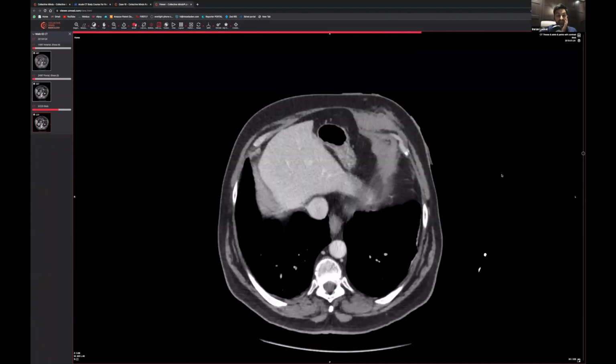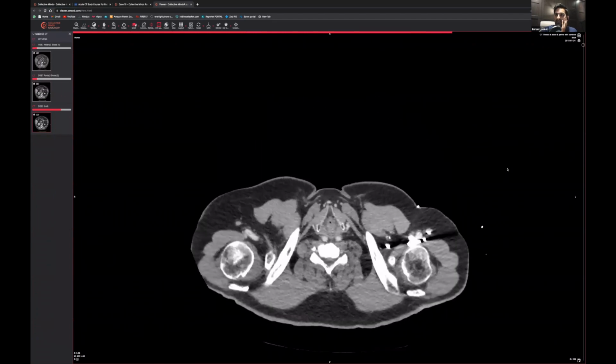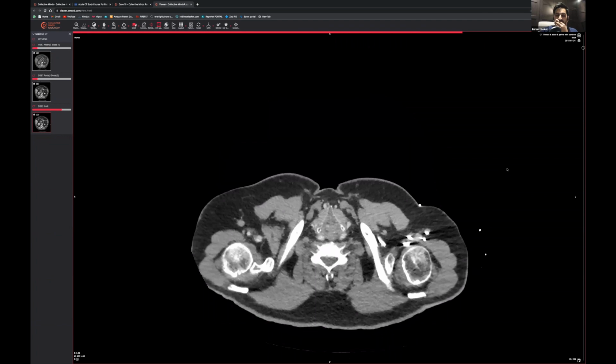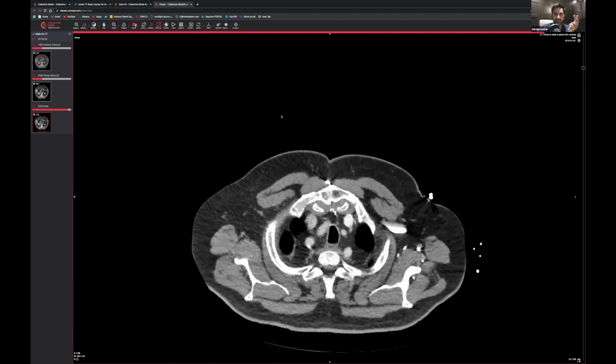So first off, we can see that this is a contrast enhanced study, right? I think, yeah, I know this one. Okay, fine. So we're going down this way. So this is a contrast enhanced study. Looks like we've got arterial phase and a portovenous phase. We've done 2 phases for some reason. The reason why you do 2 phases, generally speaking, is if someone is bleeding, you're worried about active bleeding somewhere. And usually you do that in a stabbing situation.